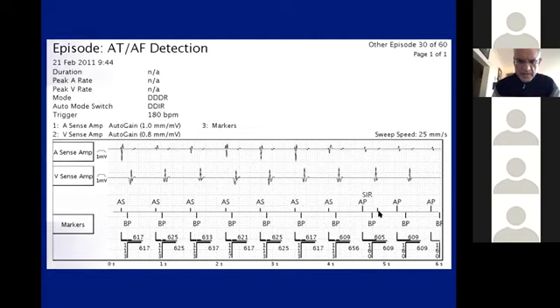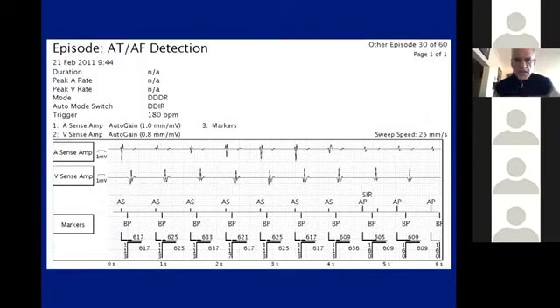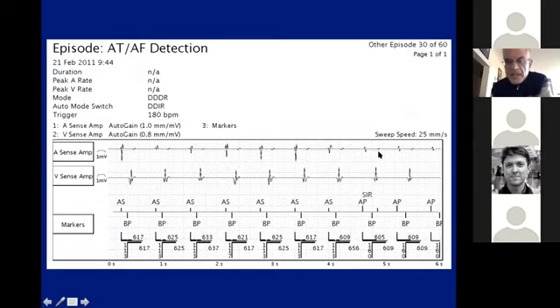All right, let's see. Can I ask something here? Sure. Why isn't the far field detected in the first part? Well, it's a good question. The timing changed. See, the timing slightly changed because A pacing starts. And just literally probably a millisecond of conduction changed, and then it's detected. The timing changed.